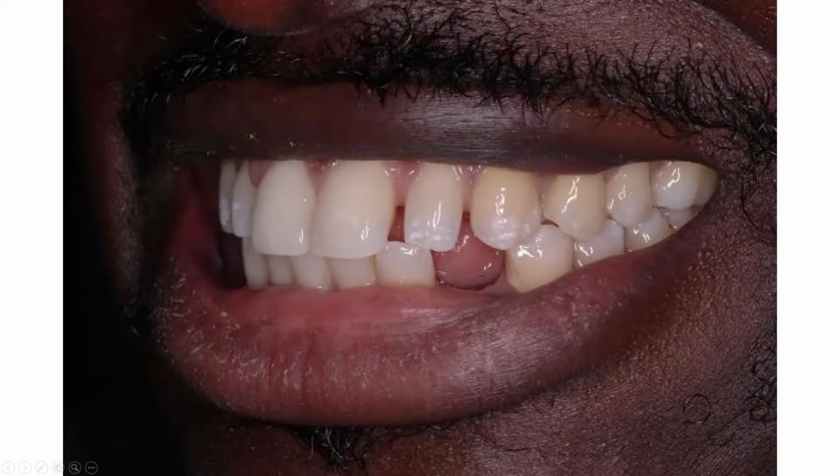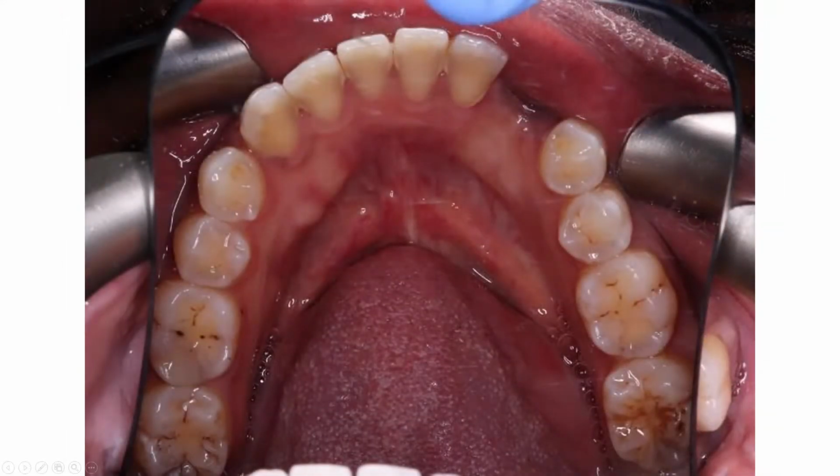We can see that there is also spacing between the lateral incisor, the upper left lateral incisor mesially distally, and the space for the lower left canine looks a little bit large compared to the normal mesiodistal width of a canine tooth. If you look at the canine on the patient's lower right hand side, you can see that there is a small space distally to the tooth, and one has to consider whether in the final restoration we're going to close this space up, or whether in fact we intend to recreate it.